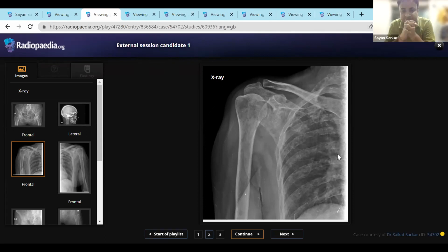On the present radiographs, the lytic lesions and the diffuse involvement basically favor myeloma. Is there anything about the size or the sites of involvement which you have seen in the present images that gives you a clue? This diffuse involvement, and the lytic lesions are very small in size compared to metastases. Any particular site? Particular site, I'm not sure about that.